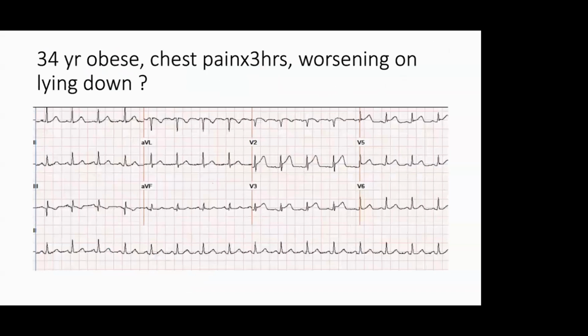This is the ECG. Can anyone tell me the findings? From whatever we have talked about, can anyone find anything abnormal in this ECG? Let us understand the minute changes coming into the ECG. The rest, I think, is very easy to identify as STEMIs, because the earliest finding is usually what we need for salvaging the maximum amount of myocardium.